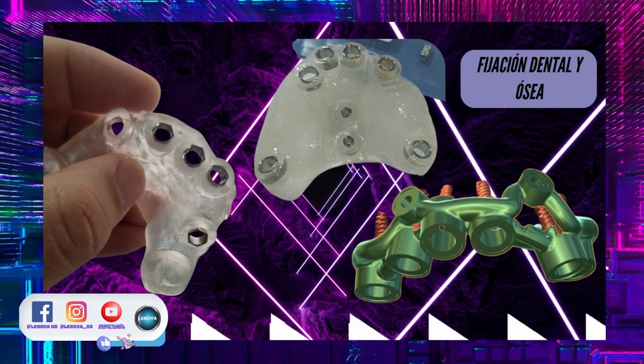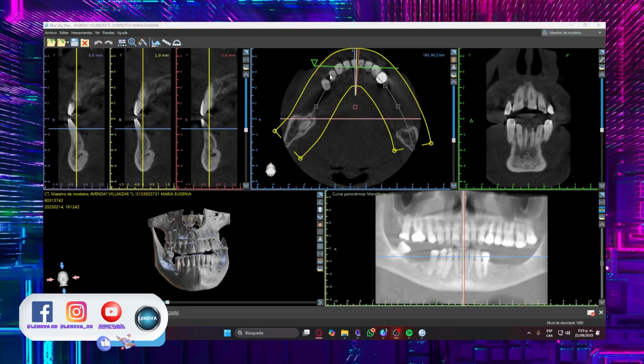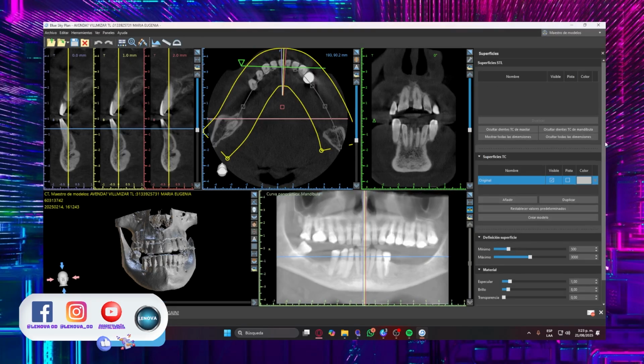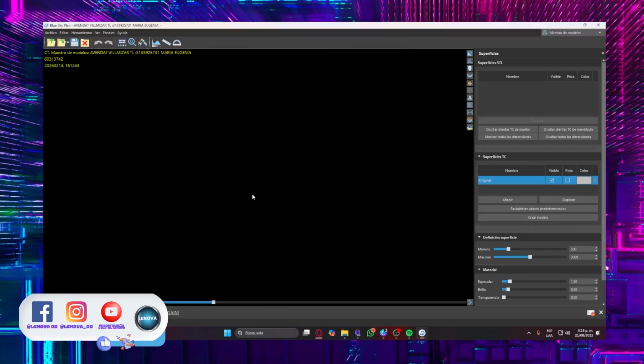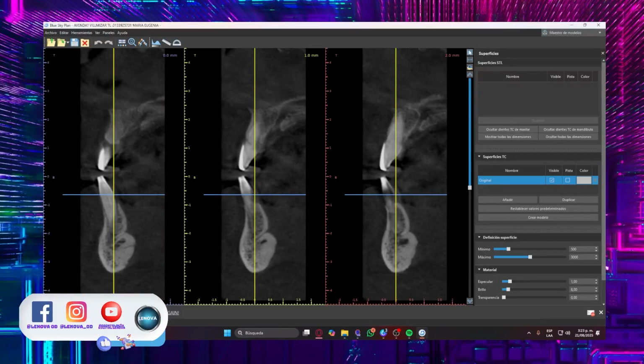So it will be a brief introduction about what Blue Sky is. Blue Sky Plan works through panels, which are the ones here. You will select the one you need and automatically have it here. Secondly, we can maximize the screens. Although there is a triangle in the corners, it allows me to increase or decrease their size.